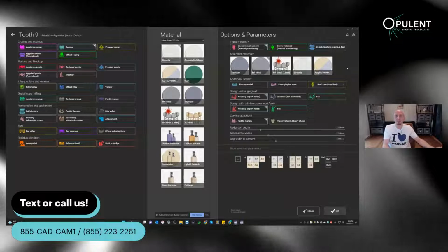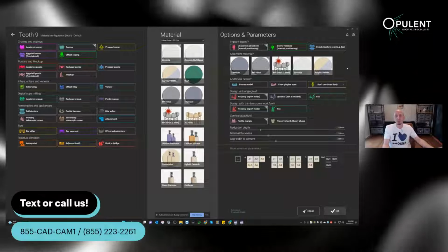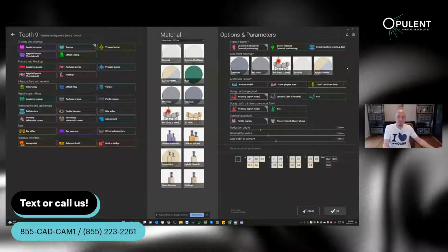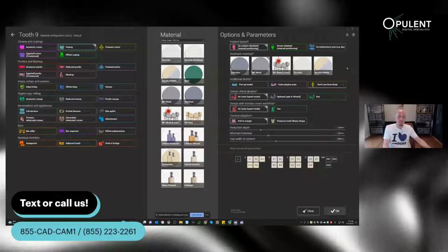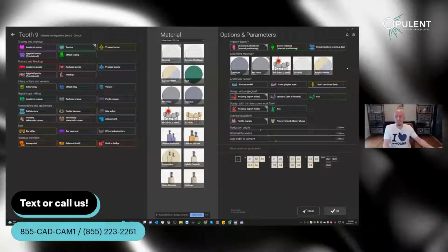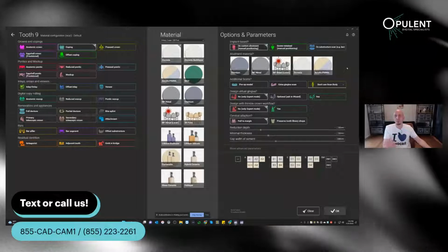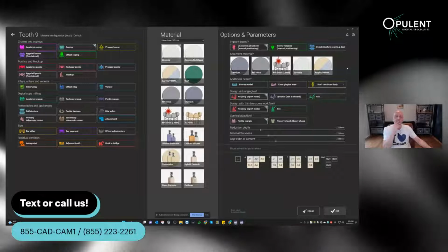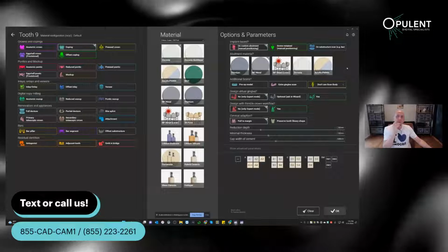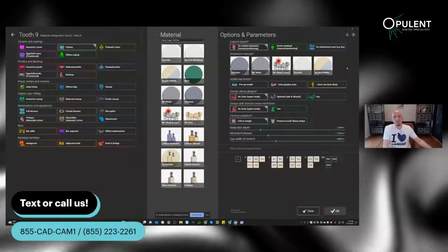I've made mistakes. I've seen people make mistakes that somehow the implant library was in the subfolder, so somewhere where it doesn't belong. And I don't want to go into the nitty gritty right now where they go, but they're basically inside of Exocad and DentalCAD app in the library folder implant. That's where they go. The library manager tool does that basically for you, and that's the way to go.